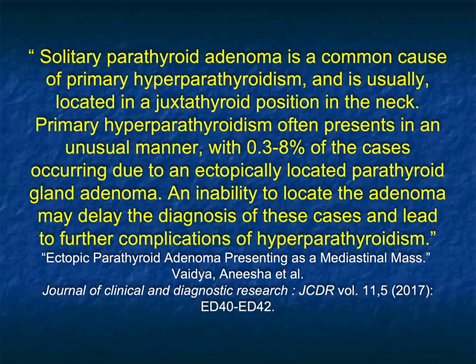Now, solitary parathyroid adenoma is a common cause of primary hyperparathyroidism. So if you're looking in a patient with primary HPT, you have to scan with contrast, good bolus, from the neck down into the mediastinum. Okay, so it can be anywhere along the course. And again, they're typically going to be small, under a centimeter, and it can be very challenging.